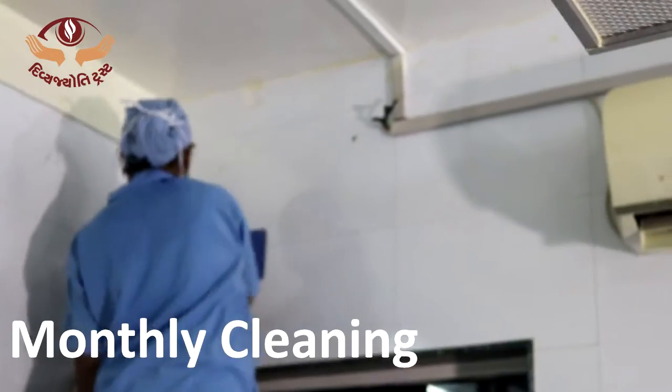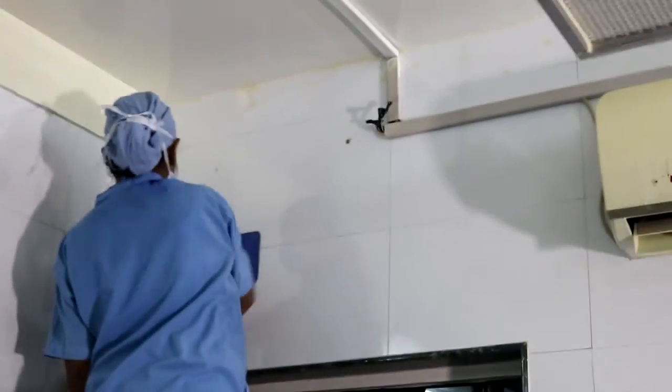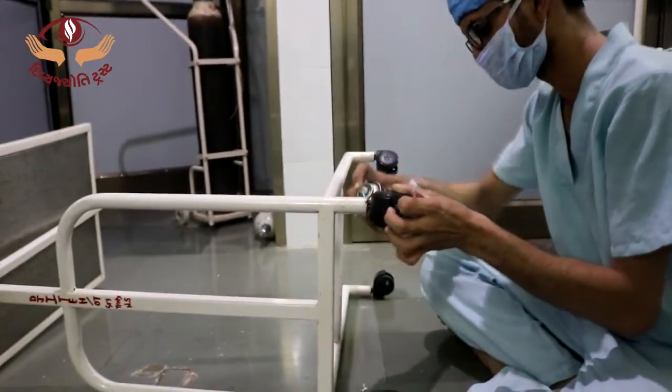Monthly cleaning. All the equipment, furniture, etc. are removed from the theatre. Particular attention to be given to corners and edges. Additionally, microscopes, revolving chairs and trolleys are cleaned and oiled where necessary.